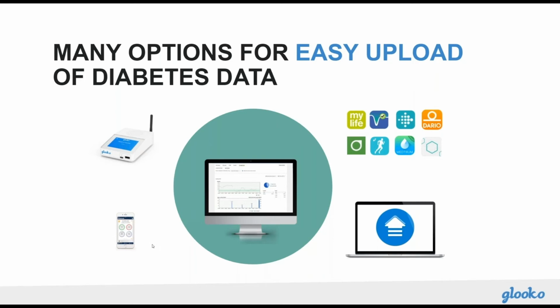Next, as we see here in the bottom left, we have the mobile app. Now, smart pens can be used alongside the mobile app with patients uploading at home to provide really the maximum level of connectivity. For the other devices that a patient may be using where uploads need to be done via a cable, we also have the uploader, which can be put on a desktop computer and allows for uploading of data at home. Now, for the devices which connect via a third-party app, we also have multiple connections with these third-party apps, as shown here on screen.